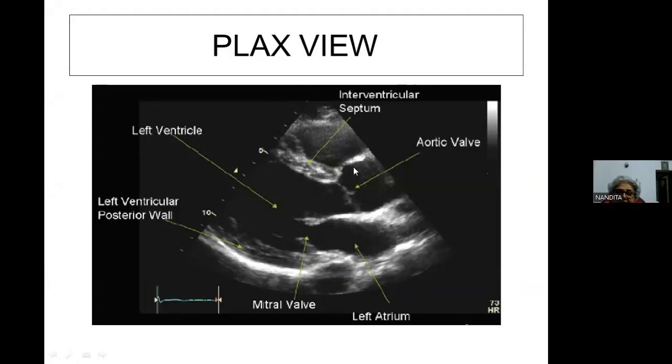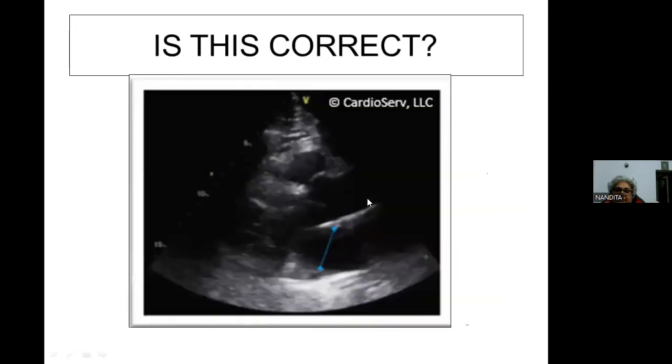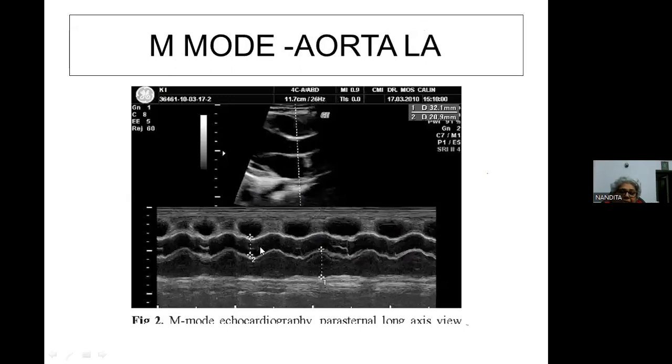Trailing means it is going behind; leading means it is running ahead. Clear? When you come down to this picture, similarly this is a line. This part running ahead is the leading edge. So in M mode, it is leading edge to leading edge. Is it a little clearer now?